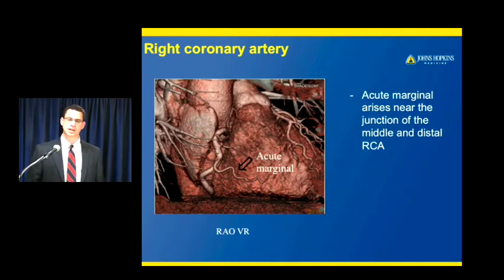This vessel, to be honest, when we're reading cardiac CT, we don't pay it too much attention. Generally, it is not a vessel that gets intervened upon, meaning that they would not, if they saw plaque there on cath, they generally do not fix it. They don't put a stent in. They don't bypass that vessel. So it's not typically something we care too much about on cardiac CT.